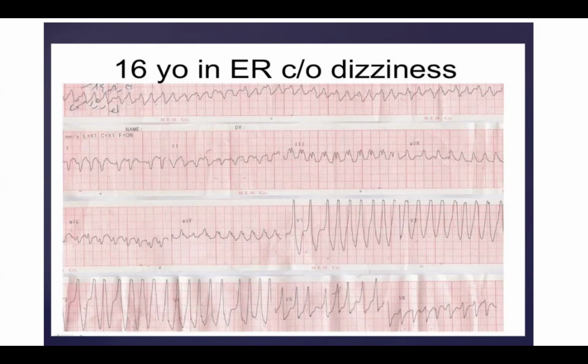I would say it's irregular. I would say you are correct, right? I mean, look at these. These look kind of regular, but then there's this sort of pause, and here's 2 beats in a row. And look at this right here. This is definitely not there. Our intervals here are not fixed at all. So yeah, this is an irregular rhythm.